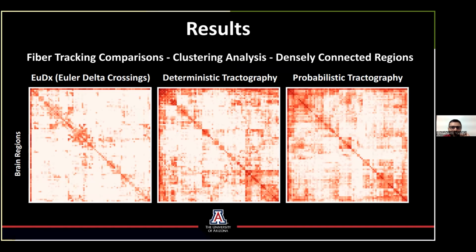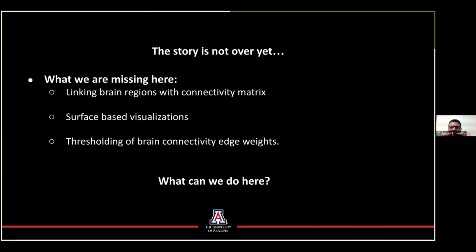And now we go to the other visualization part. So till now we've looked at how you go about visualizing the DTI images, the brain fibers, the white matter, and the brain connectivity in all regions depending on your brain atlas. But we are missing three things here.